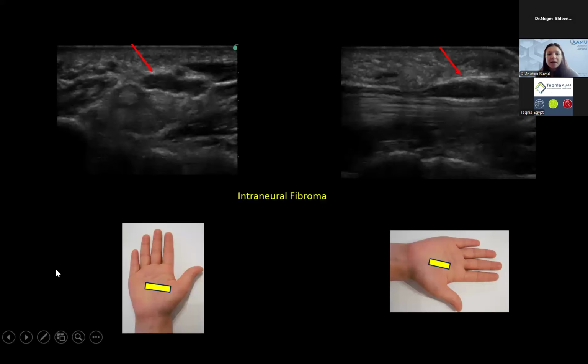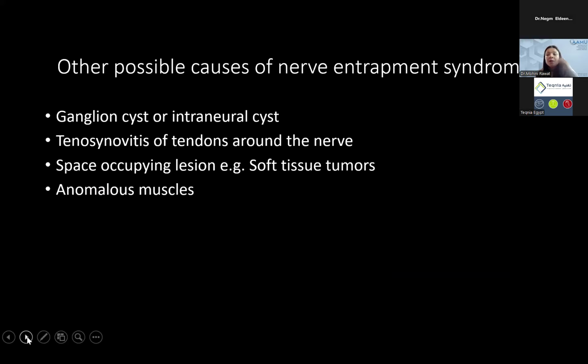So that is an intraneural fibroma of the nerve, which is mostly affecting the sensory fibers going to the third digit. So you can see how we can be biased, because this patient had a history of laceration that has nothing to do with this fibroma. It's just a coincidence that this is happening and contributing to the symptoms of the third digit. But you do have to sometimes go distal and proximal, and see why the clinical picture is not matching with the diagnostic tools here.